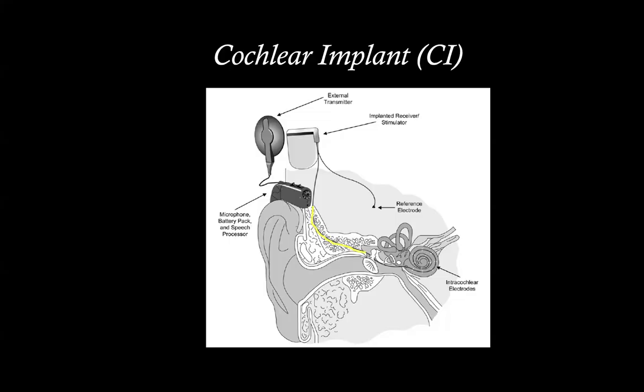Okay, now the first area that the electrode courses is the mastoid. And so we need to tell the ENT about the mastoid, and then it goes into the middle ear and enters the cochlea via round window or cochleostomy sometimes, and then it goes into the cochlea. Now, I'm not going to speak about the post-operative appearances. This will be for another lecture, but it's very, very important that you understand that all these different anatomical locations can present some issue for the surgeon.